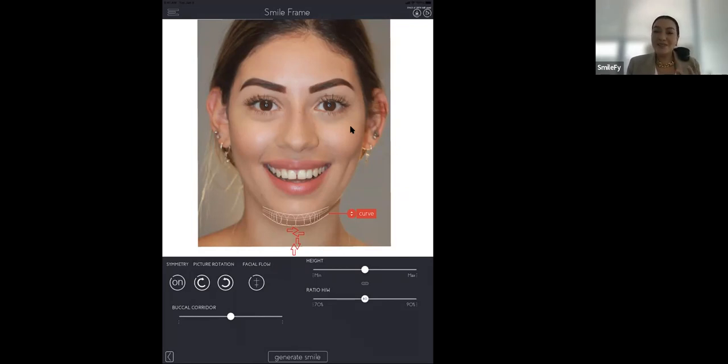The kind of smile I expect when my patient comes is that surprise smile, to make the experience nice. So they give you a smile like this. This is what I want, okay? This is super important for you to impact the patient. When you add the picture in the app, it will add this frame automatically, okay?